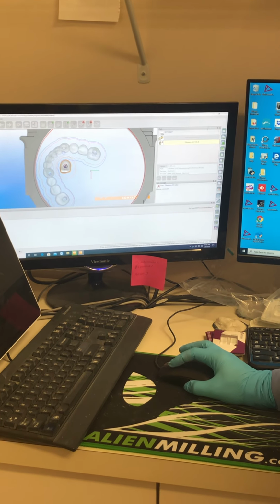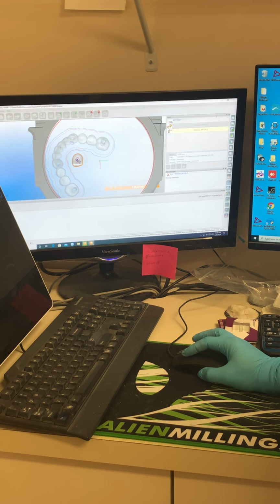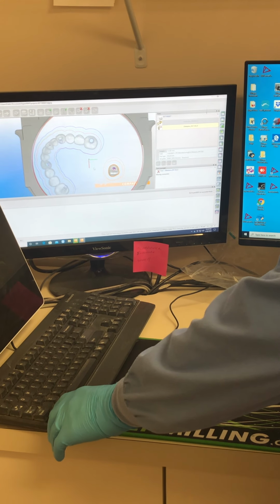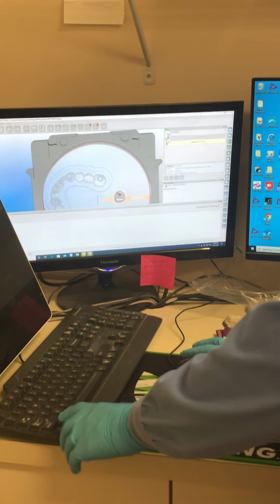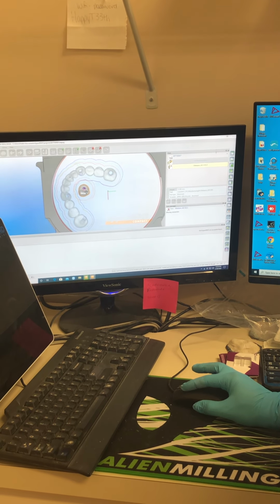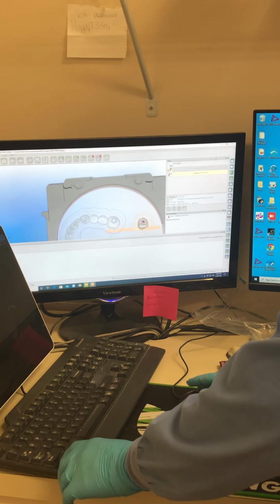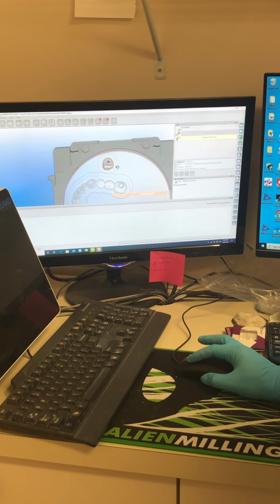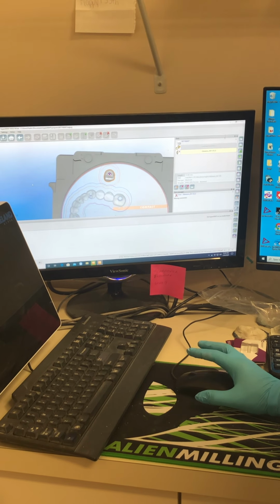Now I'm going to move it around a little bit, because I'm going to use every single square inch of this disc. Actually, I'm going to move it to the other side. Actually, there. I think this will be the best. Actually, no. Probably the best way would be right here. The reason I'm using here is because I want a remaining wall to attach the connector to. So I have this, and I click outside of the disk.